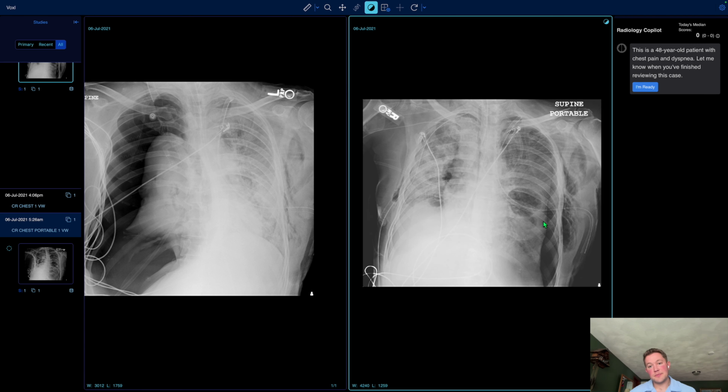Yeah, there's a new pneumothorax there, and maybe it has something to do with whatever changes in pressures that happened as this area re-expanded, and then maybe there's a tamponading effect that happened from all of this tension pneumothorax that was pushing on this, and then that got relaxed maybe, and then that allowed the visceral pleura to separate back out. I'm not exactly sure if that might be a plausible mechanical explanation, but it feels like there's also just been increased air in that left flank.